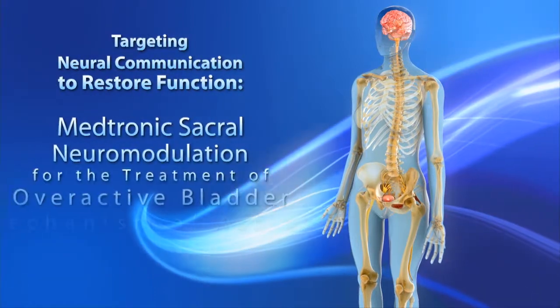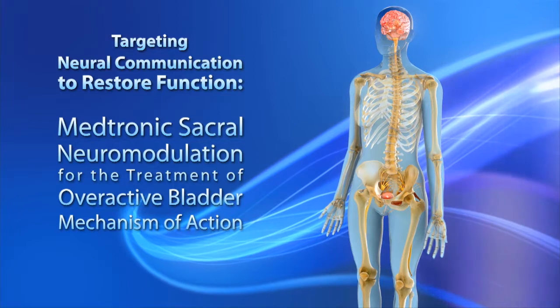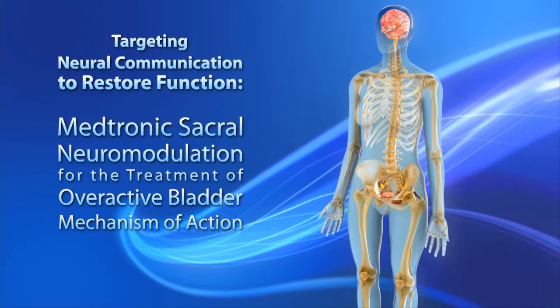Targeting neural communication to restore function. Medtronic Sacral Neuromodulation for the treatment of overactive bladder. Mechanism of action.